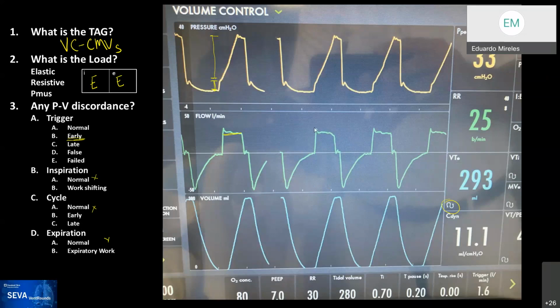Rob, any comments? Yeah, Ariel wants to know, can we say that it's not actually IMV type 4? As you said, it could be that, or it could be just regular old set point. We can't tell by looking at it because there are no patient-triggered efforts. Exactly, there's no way to tell just by looking at it.